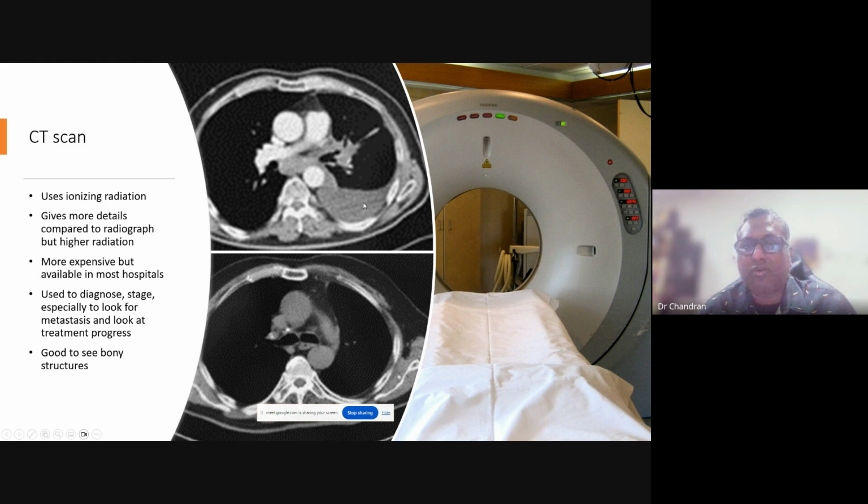So then we have what is known as densities. We have certain values for this, and based on that, we say, okay, in this particular case, this area is in a water density. Then we say this is pleural effusion. That means water in the lung, right? So basically, we deduce based on what type of image we're looking at and what type of density.